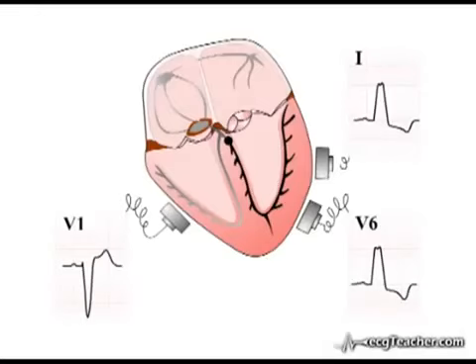The complete lack of concordance between QRS complexes and T waves in left bundle branch block should also be emphasized. In left bundle branch block, this is expected. The grossly abnormal pattern of depolarization produces secondary abnormalities of repolarization, with ST elevation or depression in various leads, and complete loss of concordance between QRS complexes and T waves across all leads.